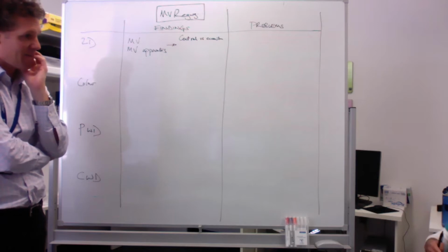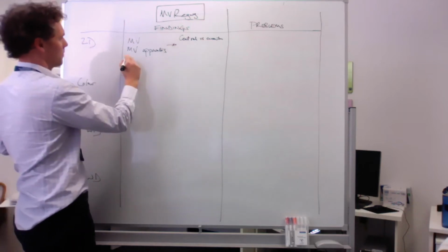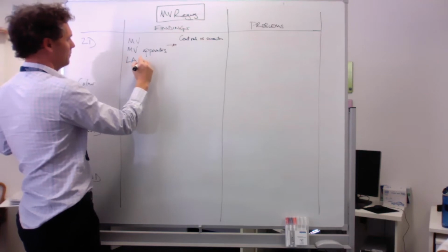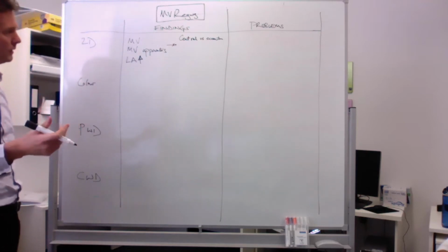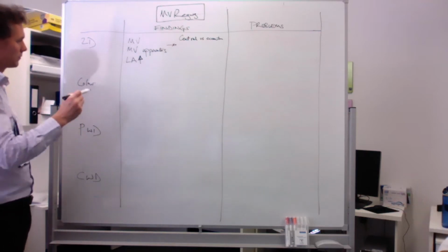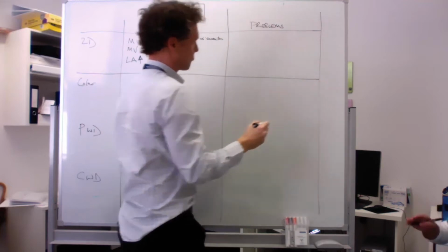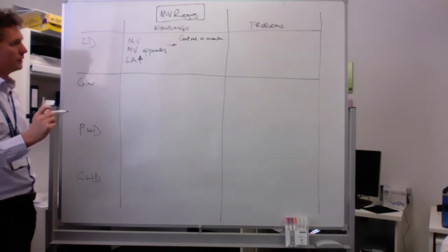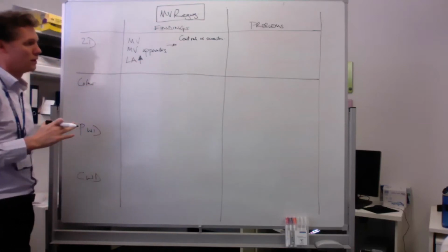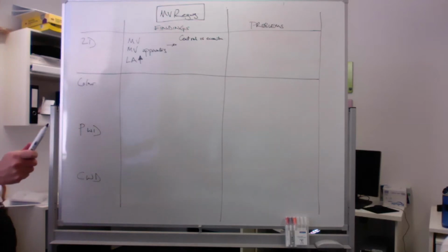the pressure effect of the regurgitation on the 2D. So basically, the left atrium will get enlarged and all those things. Nice. So the hemodynamic effect of MR. Anything else going to go up other than the left atrium? So later on, there would be an effect with pulmonary hypertension, depending on the 2D. Yes, stick with 2D for the moment. Right heart enlargement. Okay. Not at the moment. So I don't think the right heart's going to come into this.